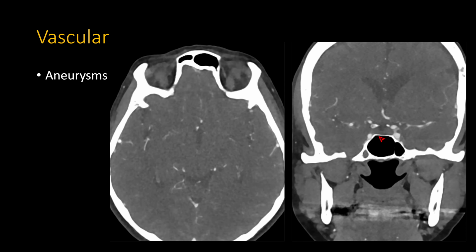And anytime you see an aneurysm, make a note of it. Make sure that you see what it looks like in all three planes and in which plane you see it best. And when you're looking at that plane in your search pattern, look specifically for that particular aneurysm.